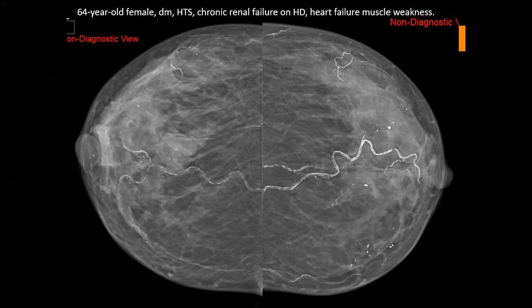The trabeculations increase, global increased density, trabecular thickening, and skin thickening is more on the right side in the presence of this asymmetry and calcifications. So with suspicious calcification, we have to consider it as a positive or relevant associated feature rather than a systemic cause.